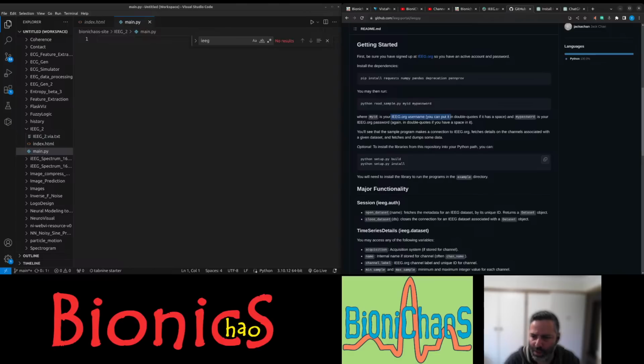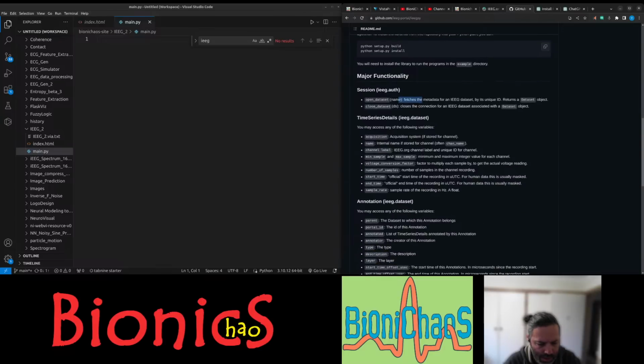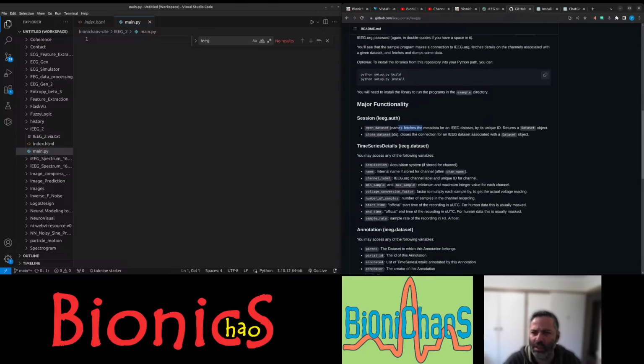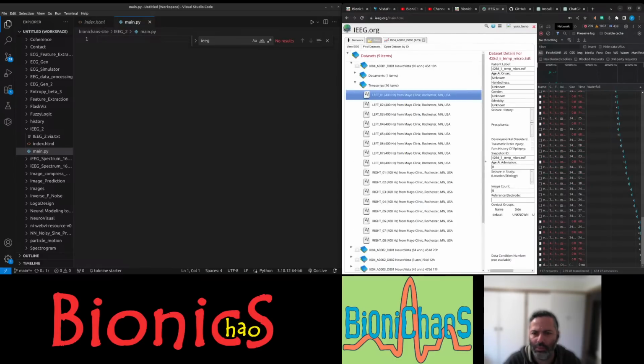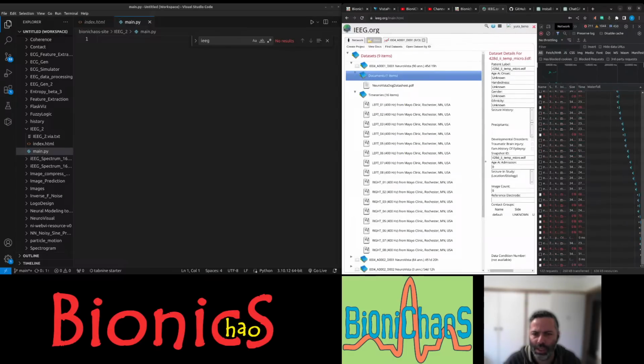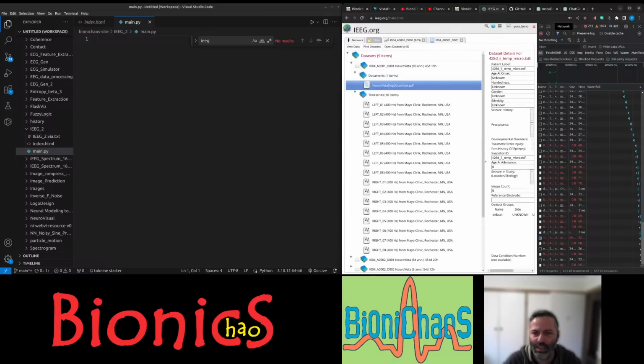We do have a username and password. So we can open dataset, close dataset. Should be able to save the dataset as well. Last time we were saving the dataset into... originally those are EDF files. Actually, close this one. Just open another. There's this documentation as well. View doc, internal error. Okay. Yeah, I don't think this one is greatly maintained.